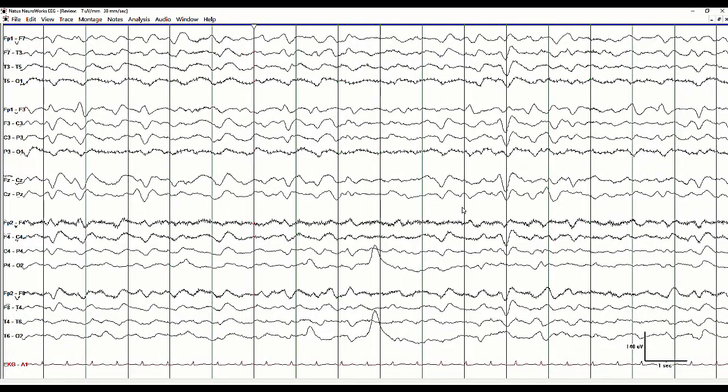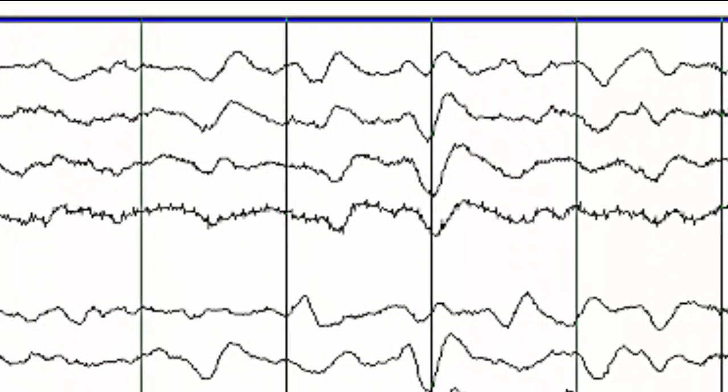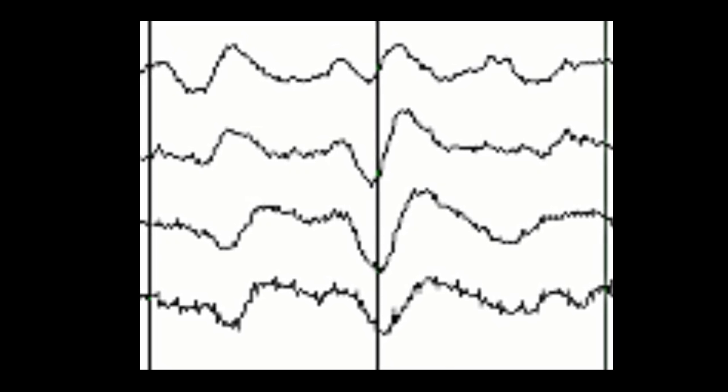Okay, well, that's it for today. We looked at an EEG that had more or less continuous generalized periodic discharges, or GPDs, with triphasic morphology. They also had, I think I failed to mention this, hopefully not, a frontal predominance. In this case, you can also see GPDs that have a posterior predominance. Those are very frequent as well.